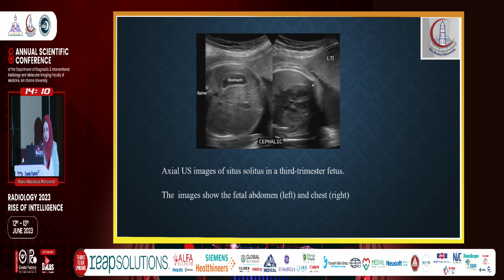This is an axial ultrasound image of a third trimester fetus showing situs solitus. The stomach and the cardiac apex are shown to be on the same side. Here's the stomach and this is the cardiac apex.